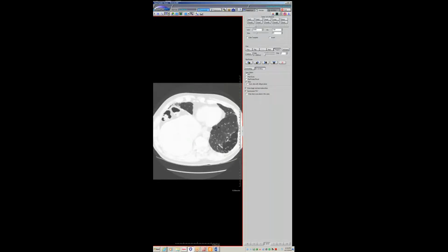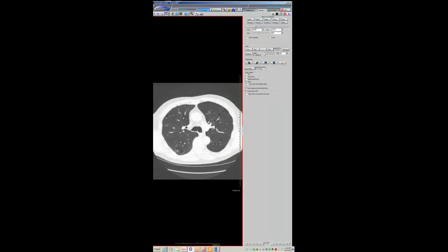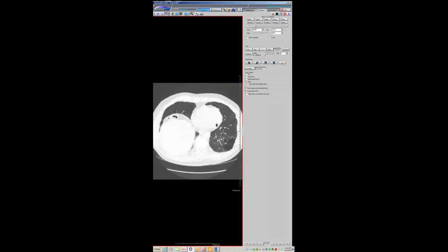So I think the one thing that's important to say is it's not honeycombing, which sometimes. Yes, no, it's not. Right. Yes, it is not honeycombing. That's what I'll call it. Is not honeycombing. Yeah. Right. There's some... Anyway, not honeycombing in the left lower lobe. There you go.